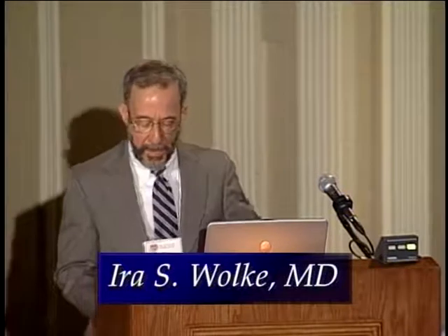Today I'm going to talk to you about the pediatric airway. You already received a handout which roughly but not exactly follows the talk, so I'm going to recommend you put it away and just try to get a look at the images here.